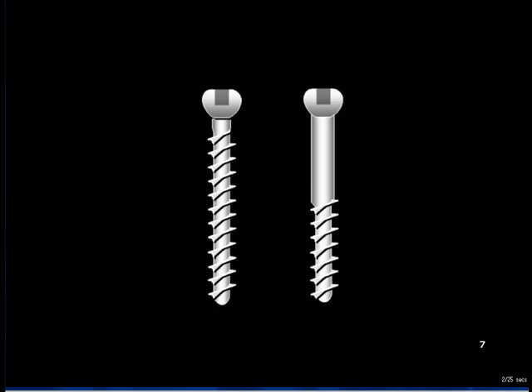Some screws are threaded throughout the length of their cores, fully threaded screws. Others are only partially threaded over a portion of the core furthest from the screw head, so-called partially threaded or shaft screws. They were also referred to as lag screws in the past, but the term lag is now reserved for describing the function of a screw, not its thread form.